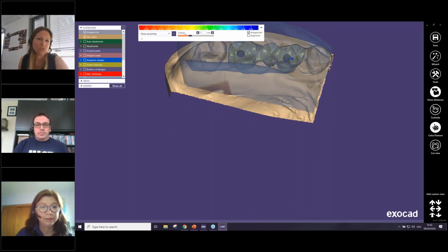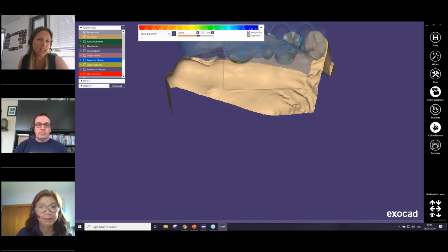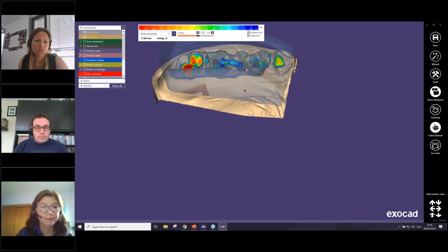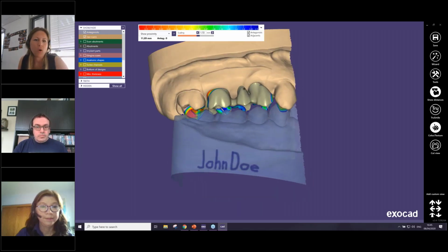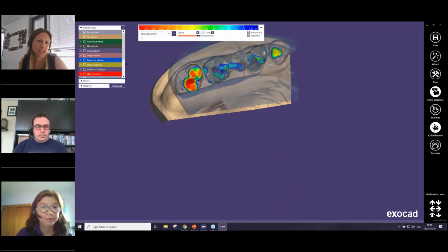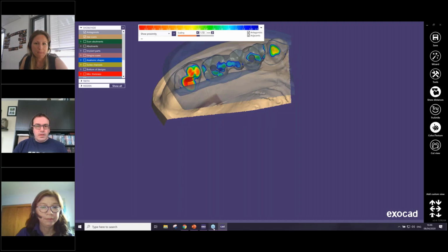You can use the scaling and the factor, and you can change this one. Also, you do the adjacencies. And over here you can include the antagonists, and then you can also see the distance a little bit, and you have a color mapping also. Yeah, I think it's okay to use something like this.